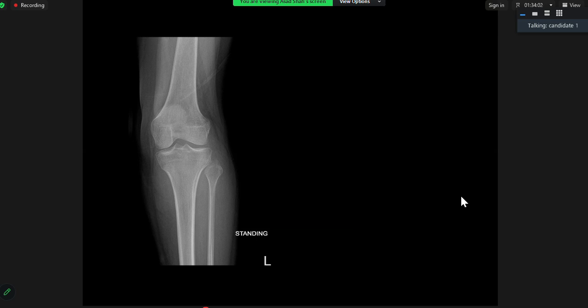I'm seeing the radiograph projection, and I could appreciate mild periosteal reaction along the lateral tibial cortex. I think that's projectional, just this one. Ignore that. Apart from that, the bones seem fine. What about the soft tissues then? The soft tissues of the lower leg appear slightly bulky.